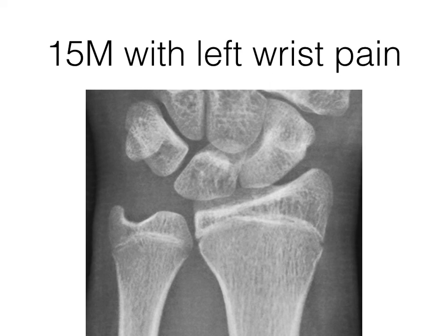But can you see the fracture? Here, instead of the other part. Fracture? No. Yes. Initially, my eyes told me that the patient had no fracture, but my physical examination told me that with the swelling and the hurting area, there should be some kind of fracture.